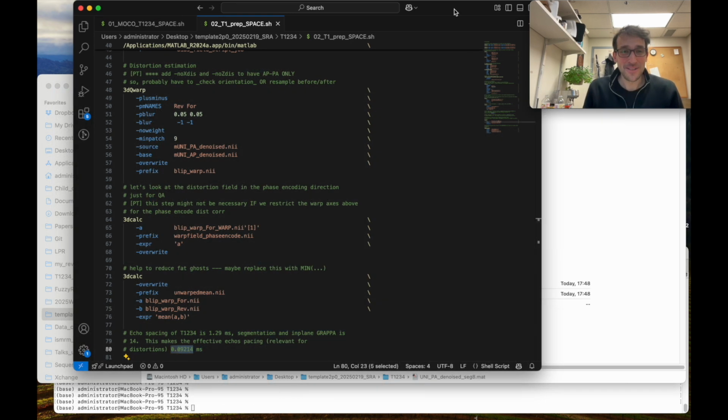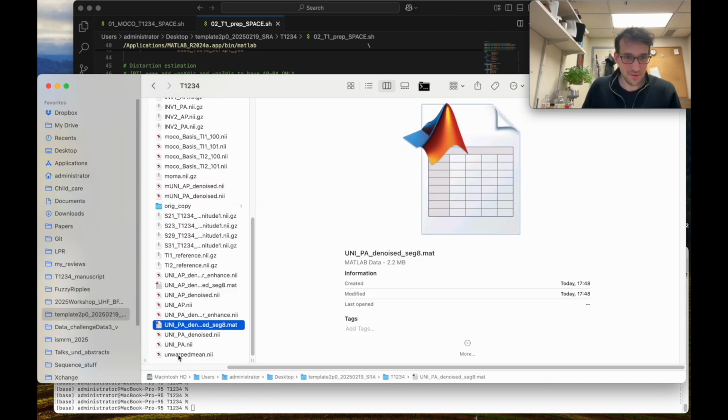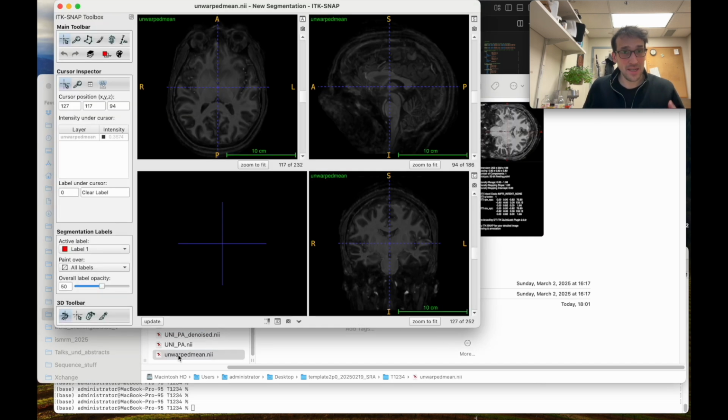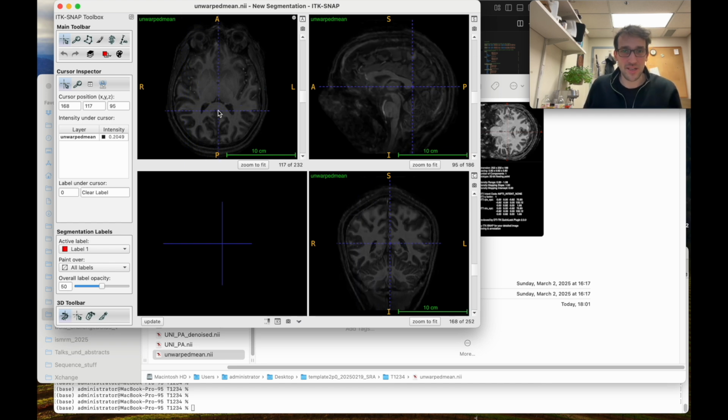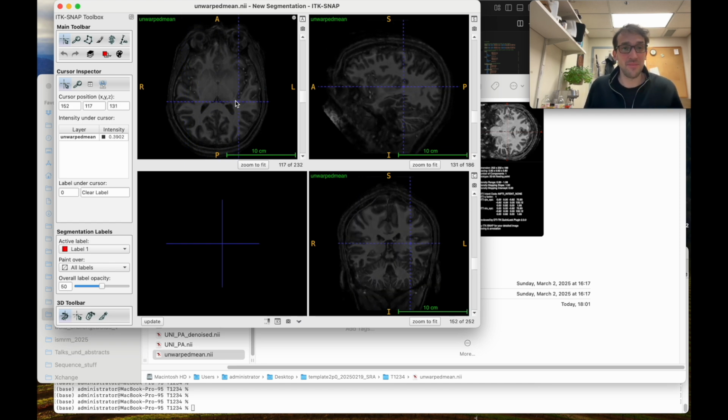So now, a few hours later, that this is all completed, we can look at some output, just to give you a feel of what this might give you. So for example, here we have these combined images that are combining both phase encoding directions, and you can see that they have pretty nice gray matter, white matter contrast, so you can directly pump them through FreeSurfer or FreeSurfer-like analyses that give you these segmentations of gray matter and white matter.